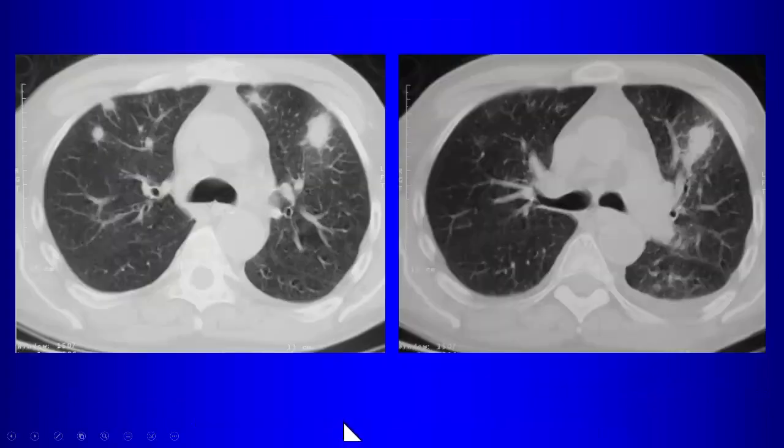Another patient with multiple lesions, what's different about the appearance of these compared to what you saw before? What looks different? These have what? Not as well defined. Yeah, so the borders are not as well defined. What else about the borders? Yeah, there's a ground glass halo. So what does that suggest? So one possibility is angioinvasive aspergillosis. What do we call the sign? The halo sign. Who gets invasive aspergillosis? Neutropenia. What kind of immunocompromise do they have? They're neutropenic, right? So neutropenic patients.